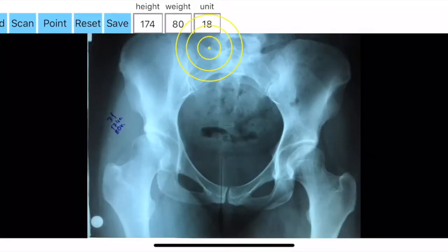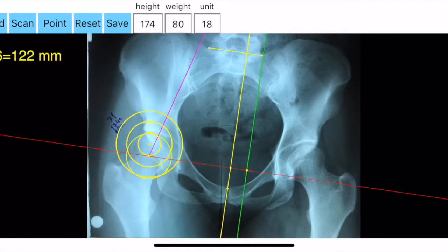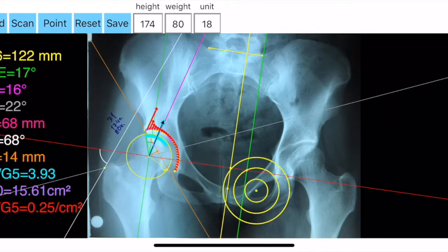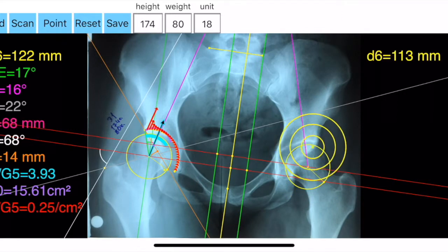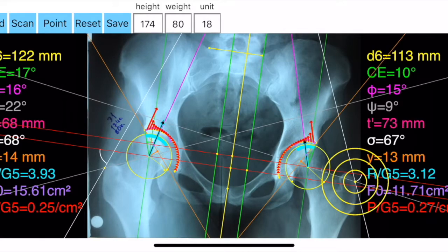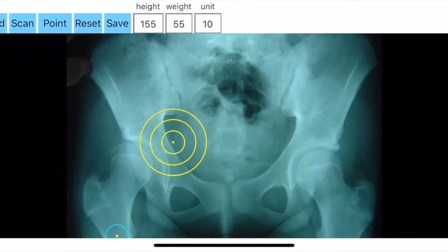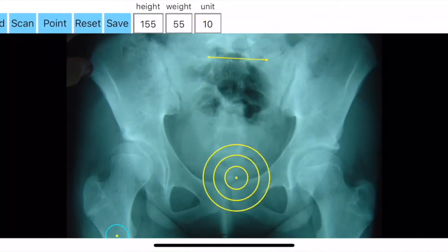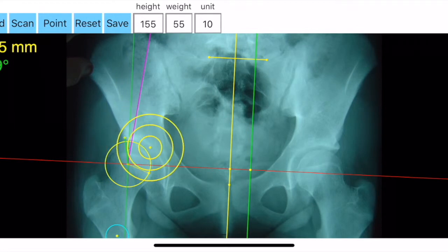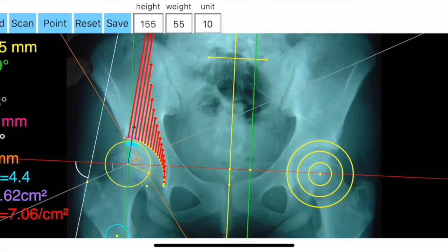The distribution of compressive stresses over the acetabulum, which is usually associated with radiographic sclerosis over the acetabular margin, is printed in real time over the screen and thus can be easily and objectively evaluated. Besides that, the app provides data and export for diagrams of load, R, and pressure, P, each of which can be plotted as a curve, allowing easy comparison with normal data and thus helping the orthopedic surgeon decide which procedure is objectively indicated. The data are printed over the screen so each case can be easily assessed.